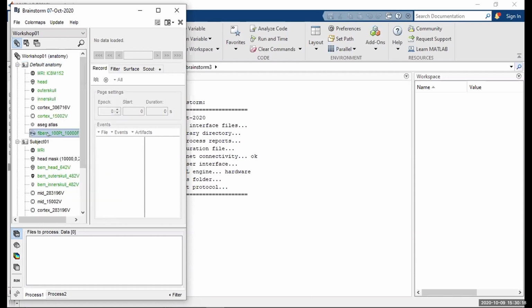And what this will allow you to do, and I will do a demo later once we reach our connectivity features, is let you display your different connectivity measures, not only using a very crude connectivity matrix or graph, but also using the actual fibers file that you have available. And note that we do share on our website a template file that was aligned with the ICBM template, such that you can try this on any subject and see how it works.